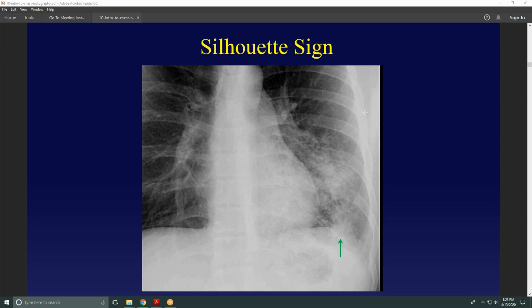The answer is theoretically yes, but it would have to have the same shape, right, to have the same radiographic density, and be in the exact right location. So the probability of an object having a concave border, the same thickness, the same density, and not being in contact is pretty close to zero.